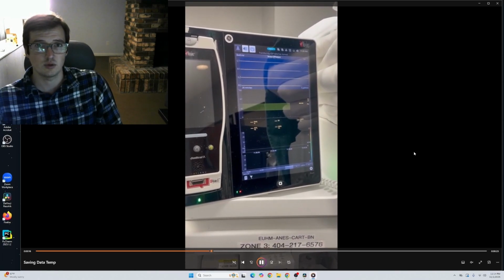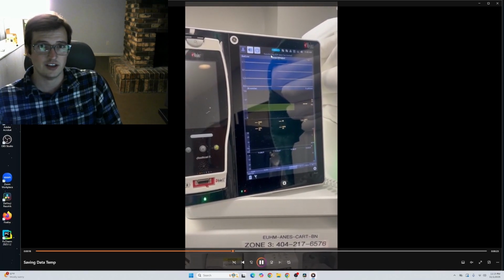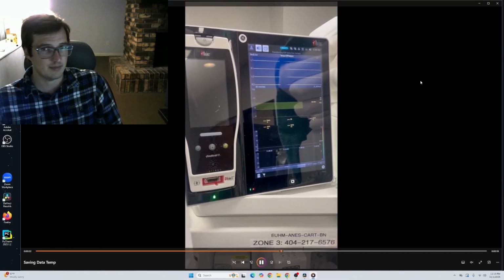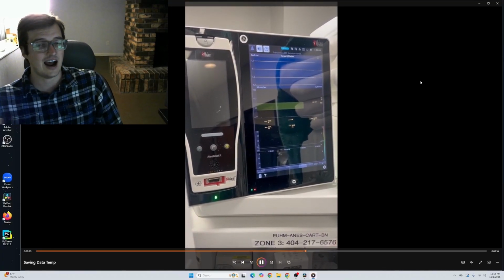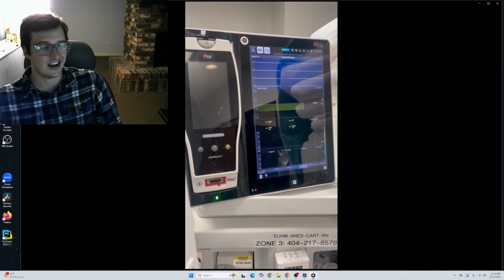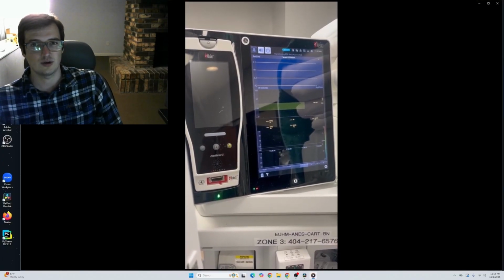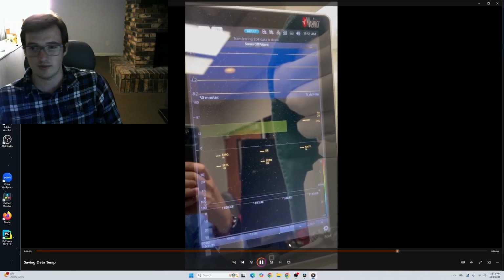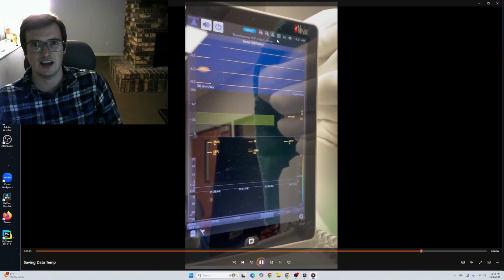And at the very top, you will see, it's kind of hard to see, the text "Transferring EDF data has started." That's going to be at the very top, and that's going to be playing the entire time your data is downloading. And it's going to take a few minutes in order for you to download all of your data. When it's done, you will get something that looks like this: "Transferring EDF data is done."